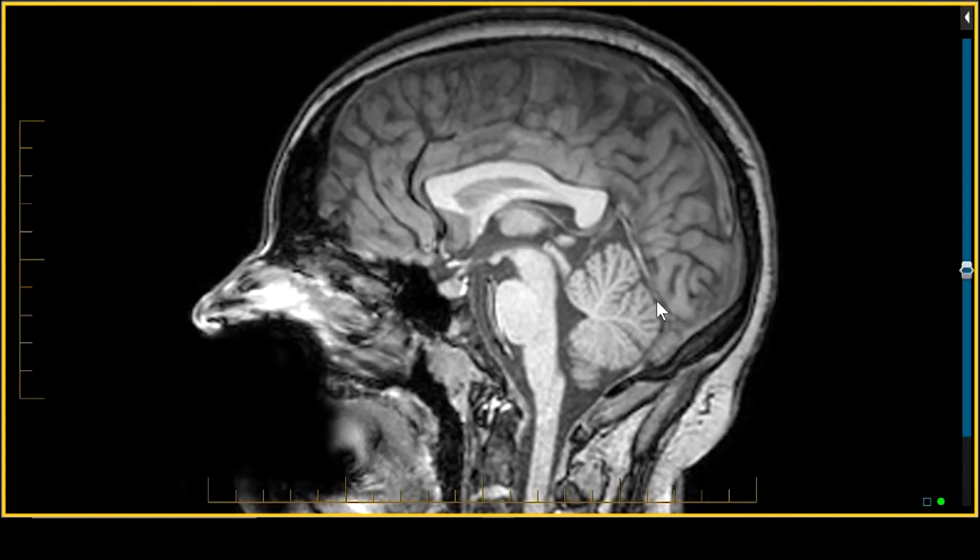Welcome to our introduction on MR of neuroanatomy. I'm going to start out with a very basic approach to neuroanatomy with a sagittal FLAIR three-dimensional 1 millimeter image in the midline showing you the brain stem, the medulla with the medullary clava, the medullopontine sulcus, the pons, the midbrain, and you see the mammillary body is a nice little landmark anterior to it.